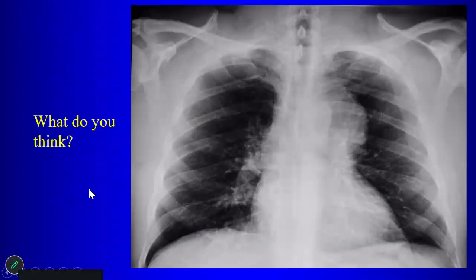Right? Chest radiograph, does everybody see where the mass is? Where's the mass? Right side or left side? Left. Left, okay, good. So we see this big mass here. Now there's a wonderful plain film sign that is illustrated here. What is the sign that's illustrated? Yeah, the hilum overlay sign. What is it? You can see the left pulmonary artery through the mass, okay? That's important because it helps you localize the mass just from the frontal chest radiograph.